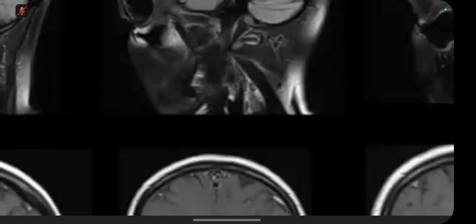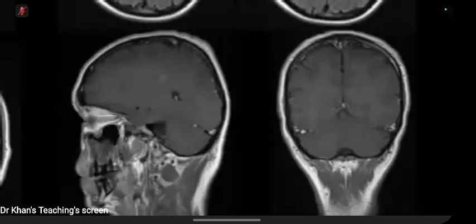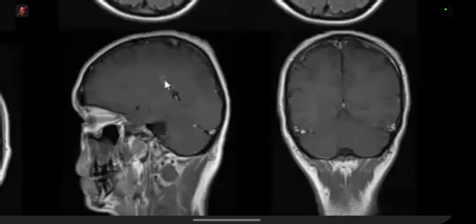The enhancement can be complete ring enhancement. It can be what we call horseshoe enhancement, like this. Horseshoe enhancement is a very good feature which can discriminate a tumor versus MS, particularly tumefactive MS, which is an exam case I'll show you. And then there can be another enhancement which is known as nodular type enhancement. If you see here, this is nodular. So nodular enhancement, ring enhancement, and horseshoe shape enhancement.